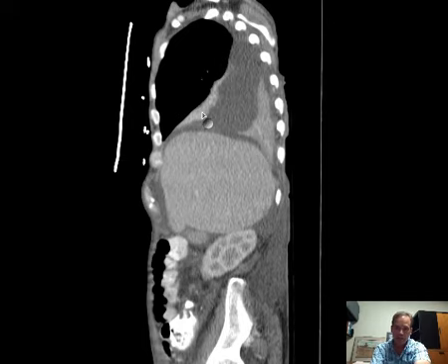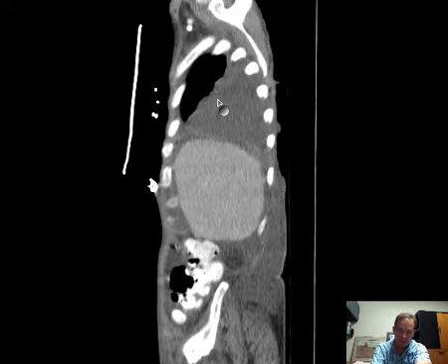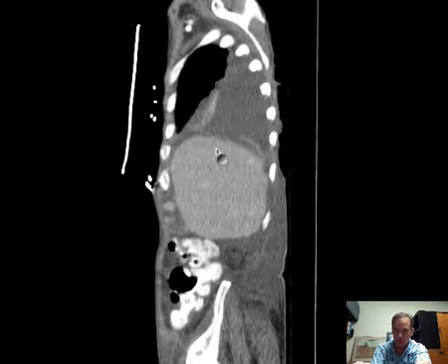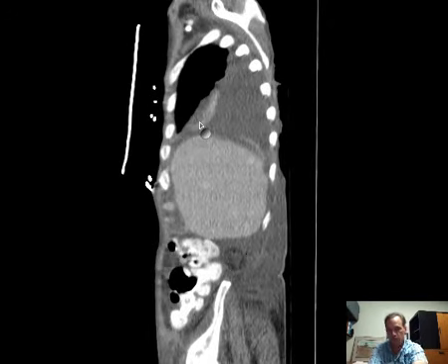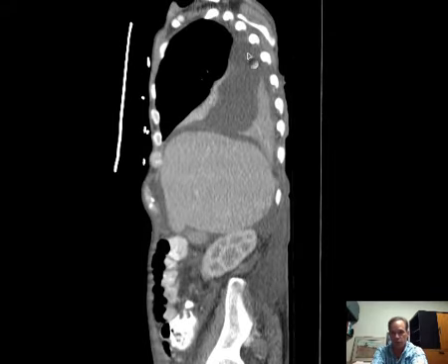So we have atelectasis of the right middle lobe, which I would say is complete, and if you follow it out laterally, you'll see that it does dissociate from the right upper lobe with a fissure that divides the right upper lobe from the right middle lobe. And of course, the major fissure, which ordinarily divides the lower lobe from the right middle lobe and right upper lobe, here is a capacious fluid-filled space.